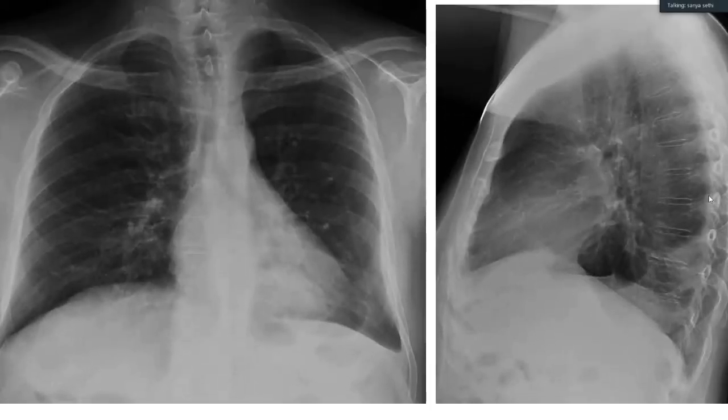So I'm provided with an X-ray chest, frontal and lateral projection, of a skeletally mature patient. Looking at the lung fields, the right lung is unremarkable. The left lung also appears unremarkable. There is a retrocardiac opacity on the left side.